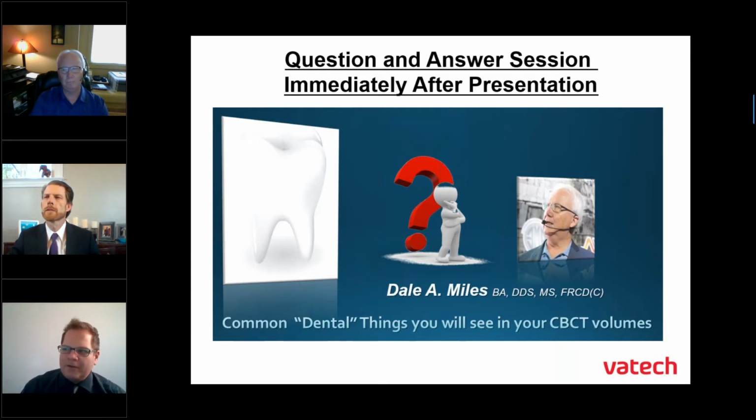Got it. Another question. Somebody just asked, Joseph, is cortical expansion a common feature of FOD? Let's just say it's not uncommon. I know that sounds like a political waffle and hedge, but I've seen them that don't cause expansion, and I've seen them that do cause expansion. Expansion is a disturbing feature radiographically when you see it, but you have to put it in the overall context of the rest of the lesion appearance. Is there any dental disease? If there's no dental disease, then you're probably dealing with something very benign.